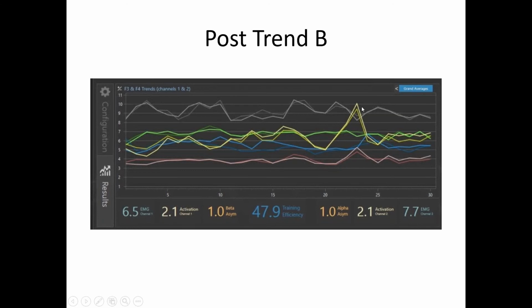We have a bad moment here during normalization. Everything's not perfect. It can't be. It's too complex. The complexity levels, we just have general patterns, probability patterns, and then we see normalization. So now we know we've squeezed all the juice out of this orange. Let's go to the other protocol at the other location.